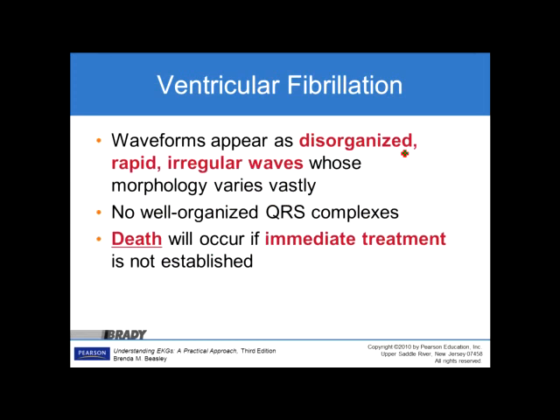Waveforms appear to be disorganized, rapid, irregular waves whose morphology varies vastly. No well-organized QRS complexes can be seen. Death will occur if immediate treatment is not established. And the number one thing that we can do in this is to shock them out of it. If they have been down for a while, please jump on them and do some chest compressions in a CAB fashion.